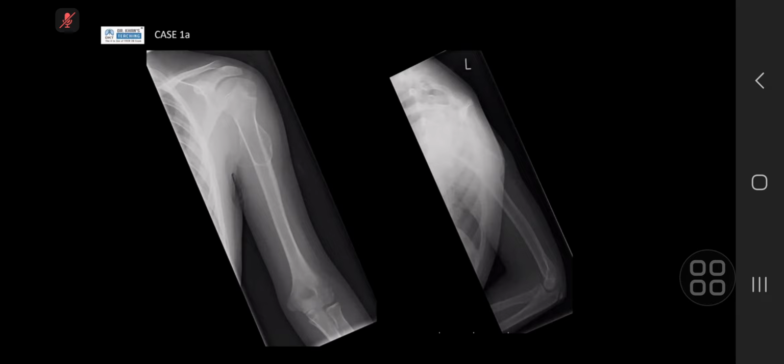Excellent. I'm sorry, I didn't catch your name. What was your name? Candidate 1. Candidate 1, lovely. Okay, so that was a really nice, excellent description. I like that you ended on whether you felt the lesion was non-aggressive or aggressive. If this plain film landed in your reporting pile, with the clinical information given that this patient has pain, would you be suggesting anything?